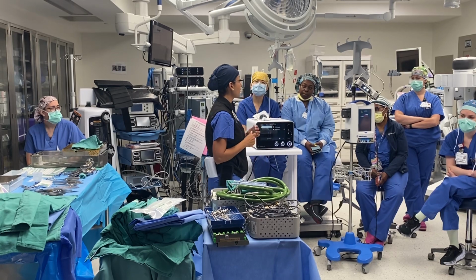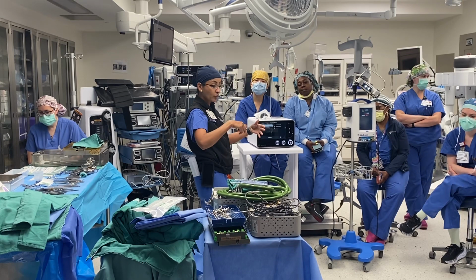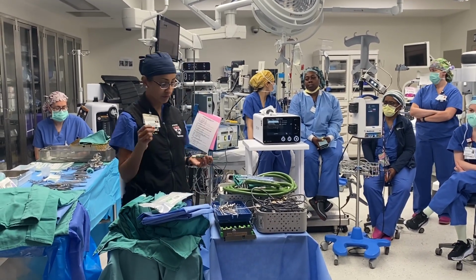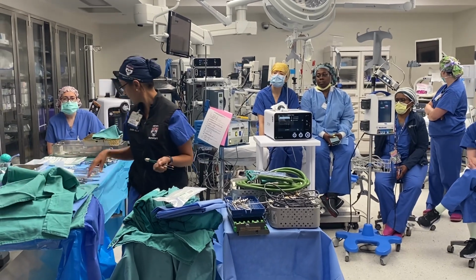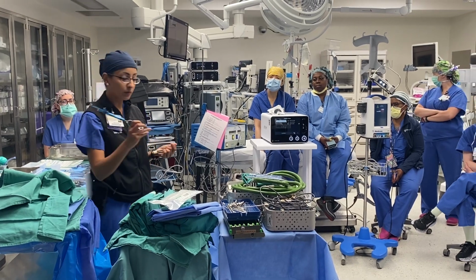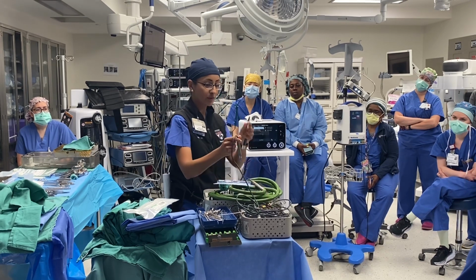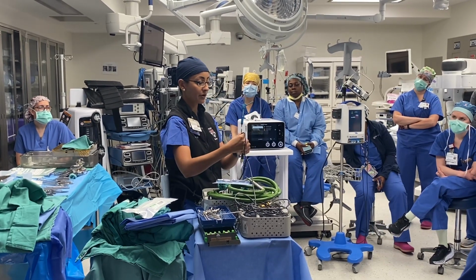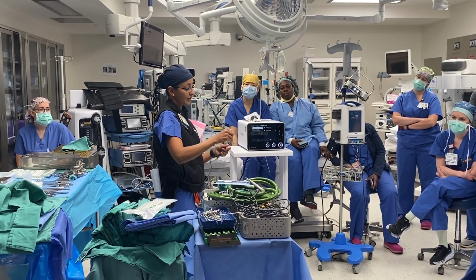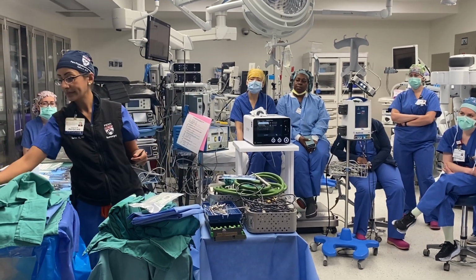The Stealth is another important piece of equipment that you guys are used to on the spine side. We use it pretty similarly in the head. Really that, the blue wand, what do I do with that? Yeah, this thing, and sometimes we will navigate other instruments with it, and what that means is we put a similar tracker to the balls that are on this thing onto another instrument, and that then allows us to use the other instrument to navigate what we're trying to take out.